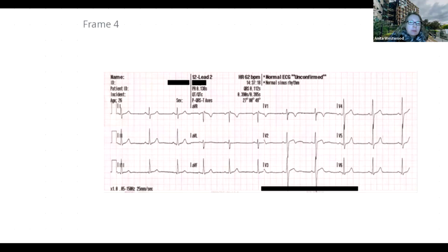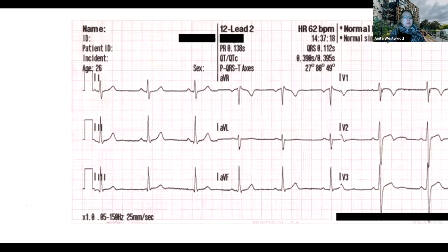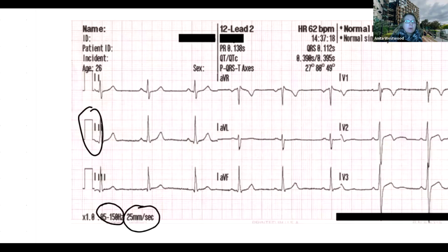Does everyone understand what we mean by the calibration box? That big box there, two big boxes, that's it. Zoom in on that. See that? We've also got the times 1.0 there as well. Is it also another confirmation? Yeah, that's it. We just had a few questions of what is that big box, those two big boxes there. That's what we're referring to.